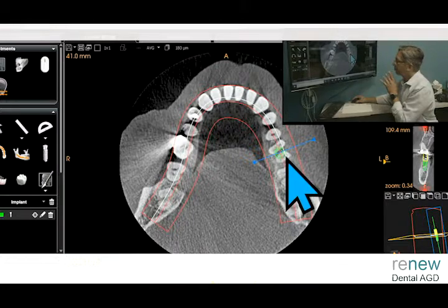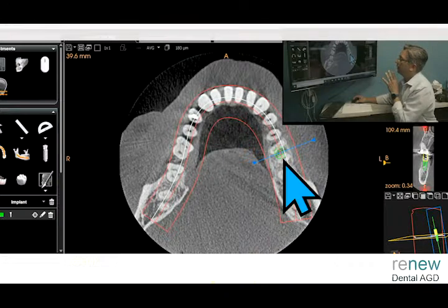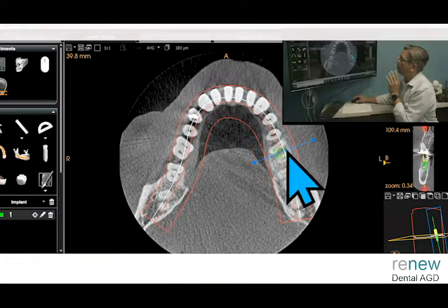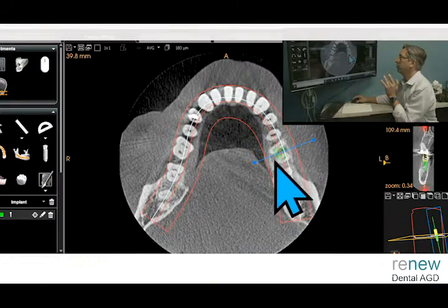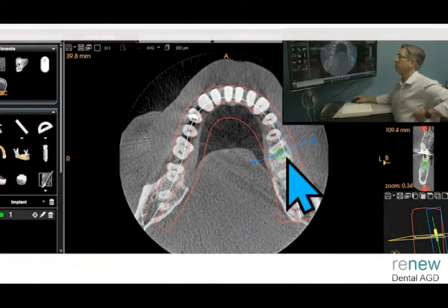When I scroll down and see the top of where I put the implant virtually, you can see that the septal bone between the two roots is going to get drilled away. So you're not going to have a lot of bone. People can drill this, they're artists, great surgeons, and probably secure the implant in. But you have so much gappage on both sides that the likelihood of it becoming looser in the next 4 to 6 weeks, when the bone becomes very weak, is very high.